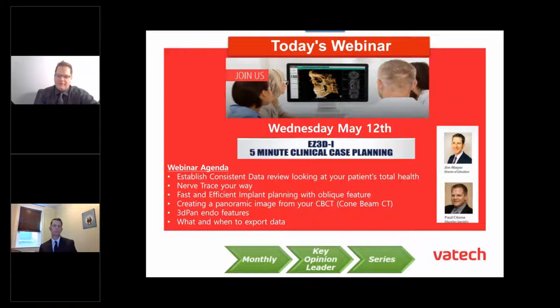We'll take a look at implant planning, 5-minute implant planning, and creating a panoramic image from your CBCT, using the 3D pan for multiple reasons, including endo. And then finally, we'll finish up with what and when to export from the software. There's a few ways to do it, so we'll look at the best ways to handle that function also.